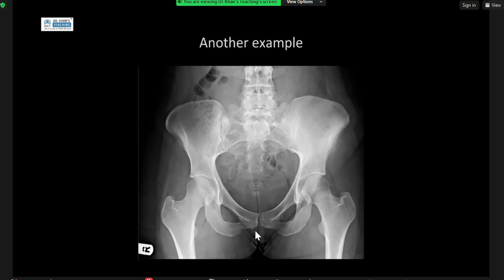Okay. In this AP radiograph of the pelvis, I see the left iliac bone cortex showing dense sclerosis with a periosteal reaction and a soft tissue component. There's a wide zone of transition with an ill-defined margin of the lesion infiltrating the left iliac bone. In this region, I'm going first for Ewing sarcoma. Could be. How was this?